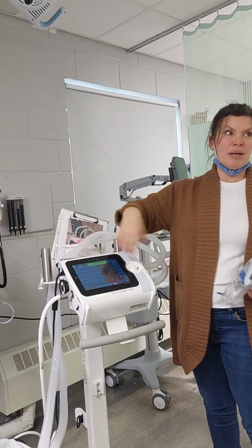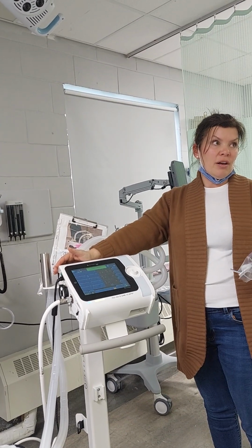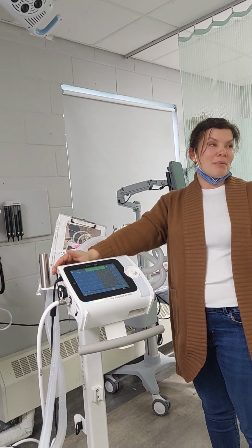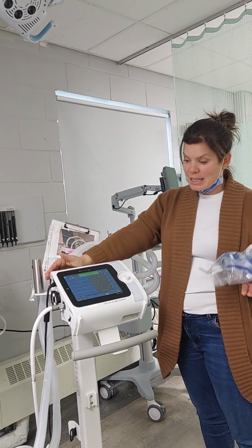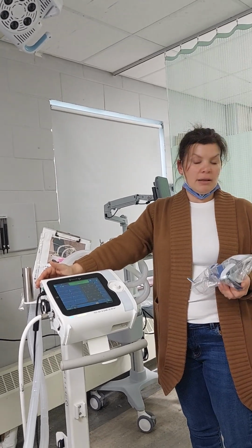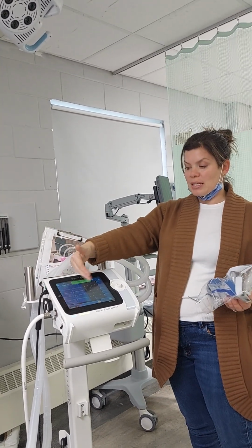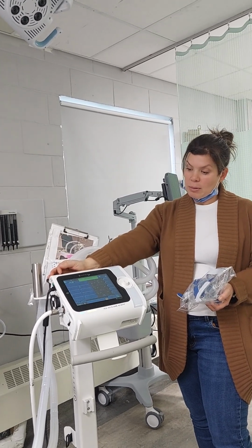It's very basic. Patients tolerate this well. Sometimes, if they're trying BiPAP as more of a trial, they'll try CPAP to see if it works before saying, forget it, we're going to intubate. But it's just so you know it's there. Typically BiPAP is what you'll probably do a little more, but it's there.